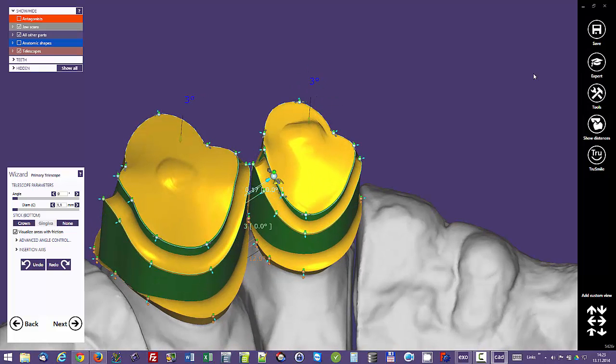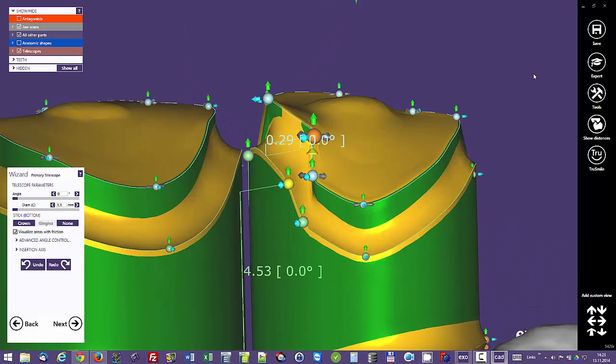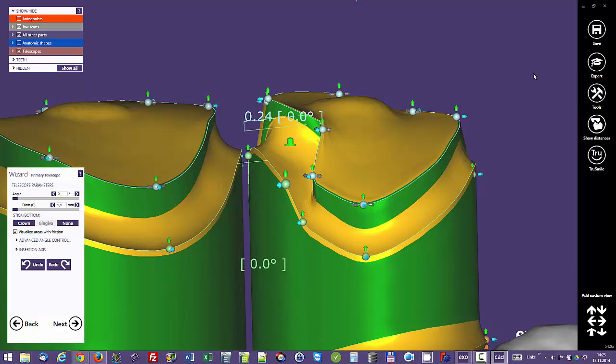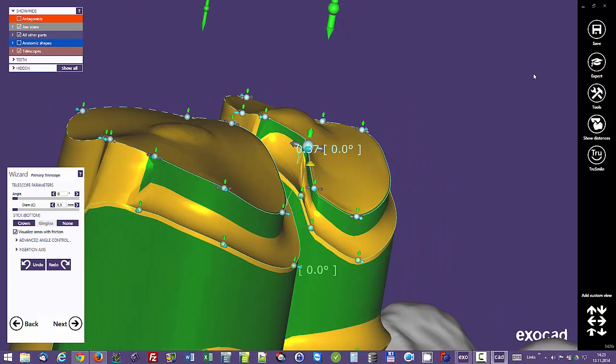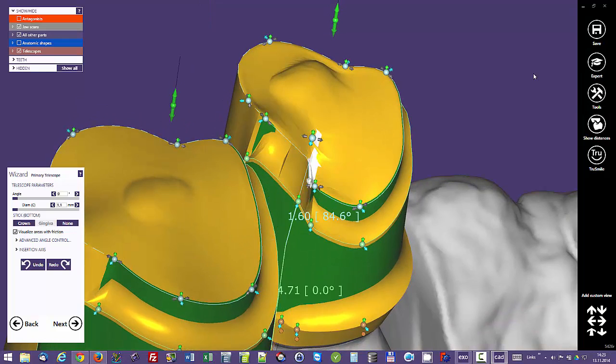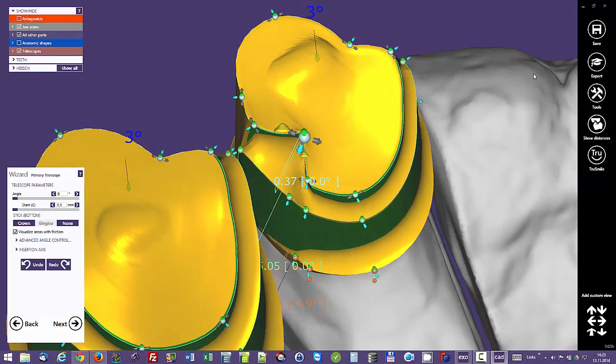With the upper curve you can now orbit the area where you want to place the interlock later. It's a little bit tricky because the more points you have, the more difficult it gets. Try to avoid having too many points on your restoration.